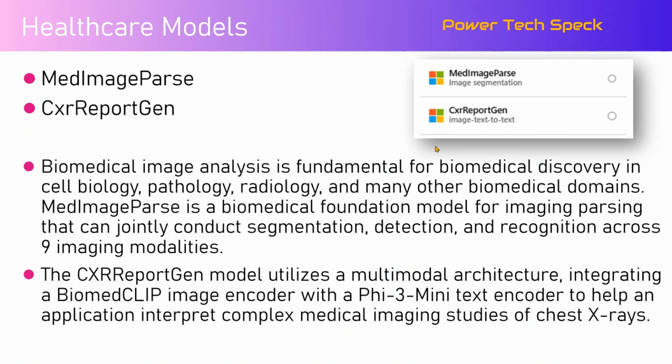But there are a couple of models which Microsoft has provided, like MedImageParse and CXR Report Gen. Now I'm going to look into the disclaimer part as well once I start exploring the model. I don't have a specific demo for it. I have started deploying this model, but it started giving me a token related error, so I've just left it as it is. But just to give you context, there are a couple of models which I have labeled from a healthcare domain: MedImage and CXR Report Gen.